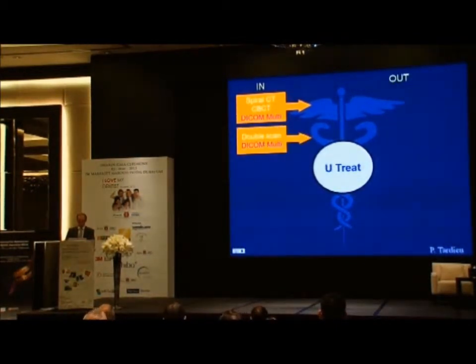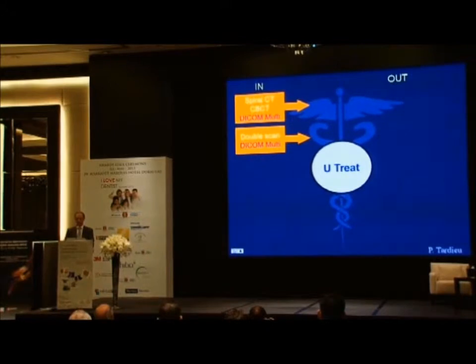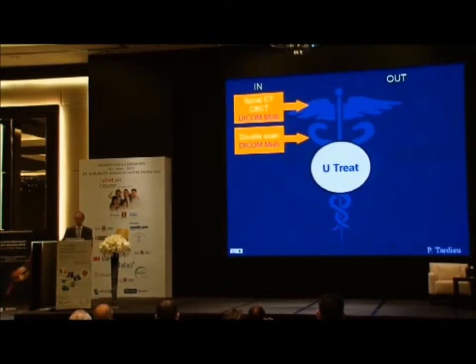We can also work on a double scan technique. What does that mean? This means that you can overlay one DICOM over another DICOM. We call that the double scan procedure, and this is used when we overlay a second CT scan of a full denture over the CT scan of the patient wearing the denture. This allows us, since 2001, to work on the gingiva with a surgical guide applied and supported at the gingiva. This is a very important step that was done in 2001.